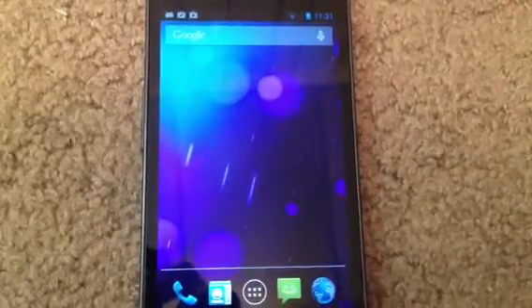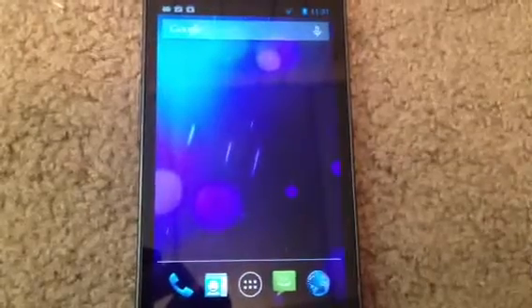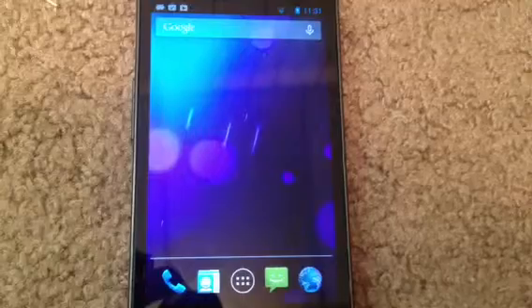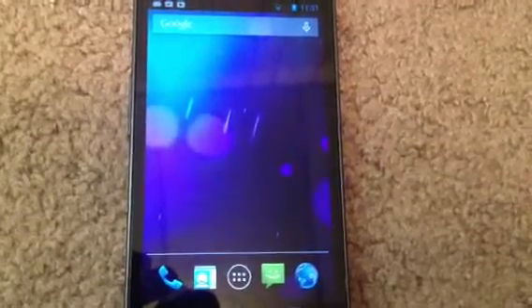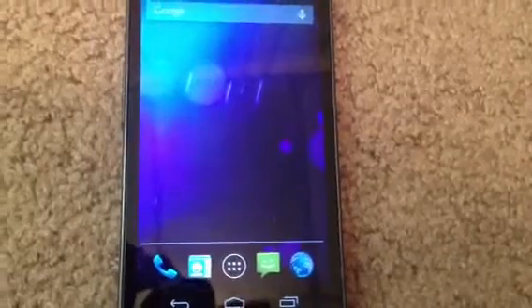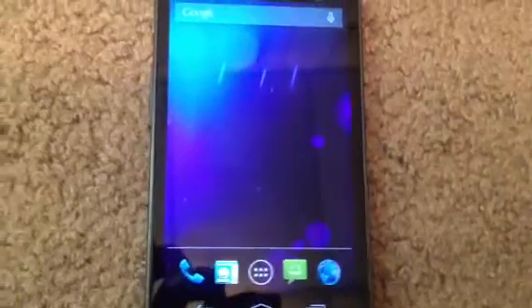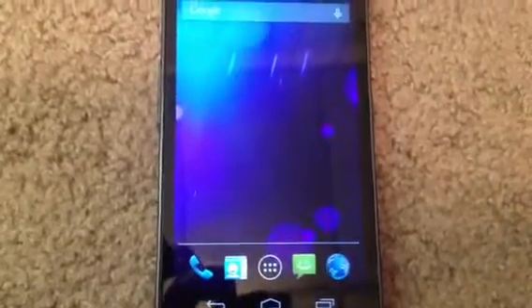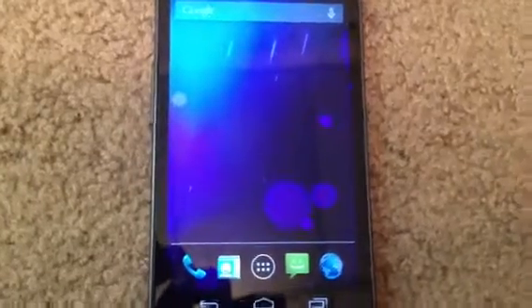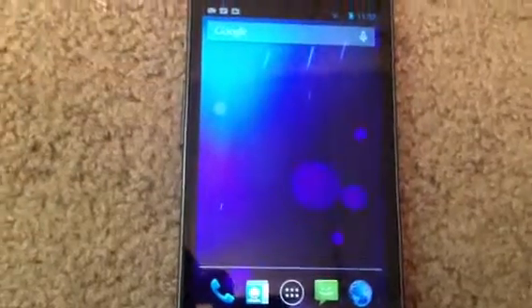This app can be used to keep track of the blood glucose levels and insulin intake by type 1 and type 2 diabetic patients. The most important aspect of the application is that it simplifies aggregation of data from various devices like continuous glucose monitors and insulin pumps. So all this is stored in a single platform, and for that platform we have used Google App Engine. So let's go into the demo.